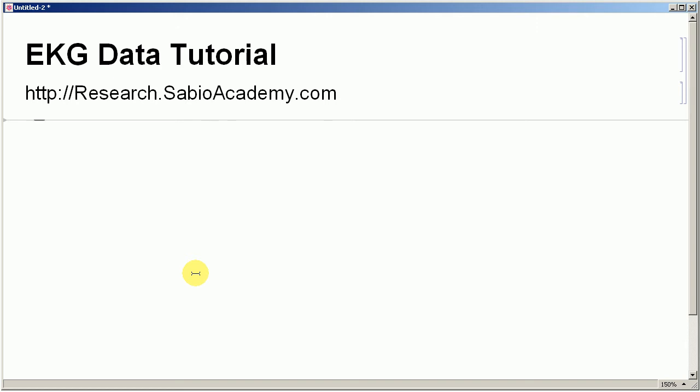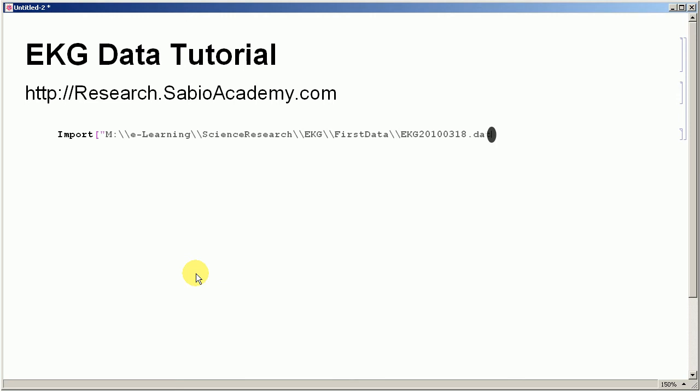I'm going to show you how to read this EKG data. When I first received this data, I was not sure how to read it. The file name was nondescript.dat. So if I copy the file name here, say yes, that's what I had. And that doesn't explain to me anything actually. .dat, what's that, right? So I had to see what's available inside.